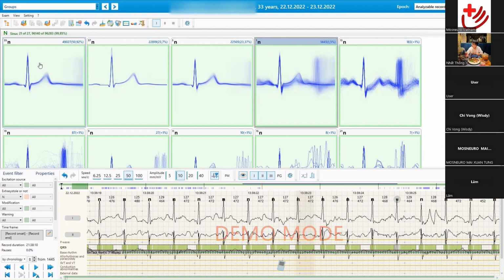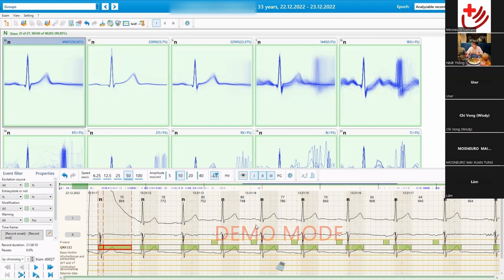Another tool that you also need to think useful in these groups, we already faced the thing that we can, here on this ribbon tool, change, for example, the end of the T wave marker, the J point marker, but it's difficult to change for all the complexes.